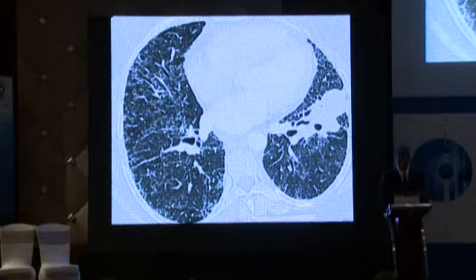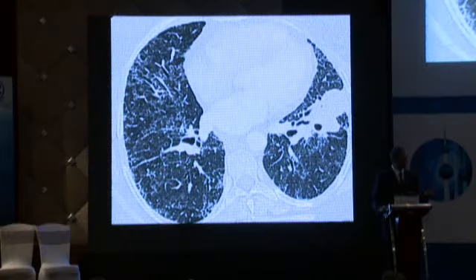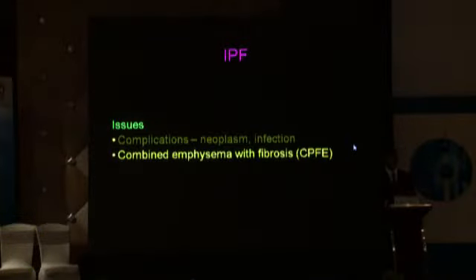So when we see a focal opacity in a patient who otherwise has IPF, we would need to figure out whether this is tuberculosis or malignancy and typically do a CT-guided or bronchoscopy-guided biopsy. This patient had tuberculosis. Luckily, though it doesn't really matter, because if the 5-year survival rate is less than 20%, all that this does is hastens death a little more. And this patient had consolidation with ground glass attenuation that eventually turned out to be bronchoalveolar carcinoma.